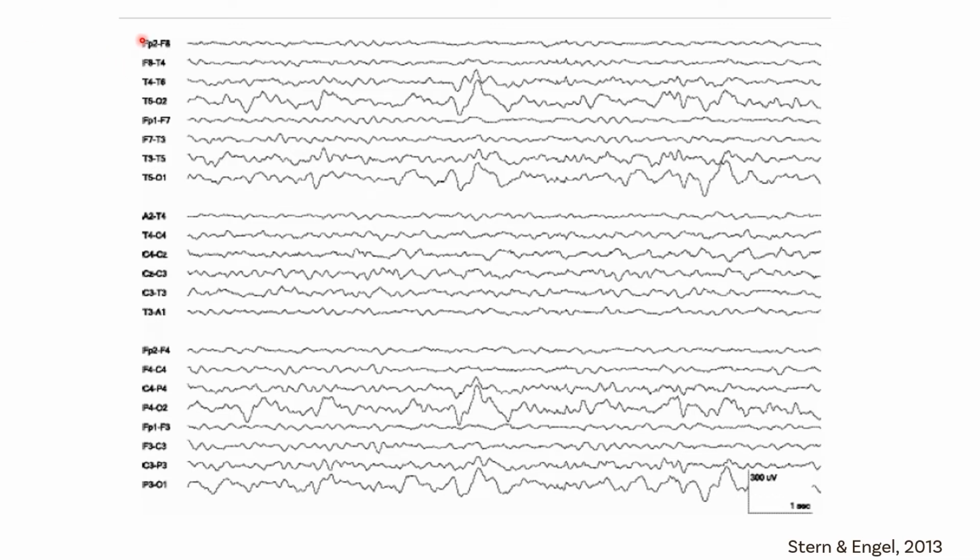Now, this montage is a bit strange because we have the right temporal region over the left temporal region, and then right central over left central, central temporal.